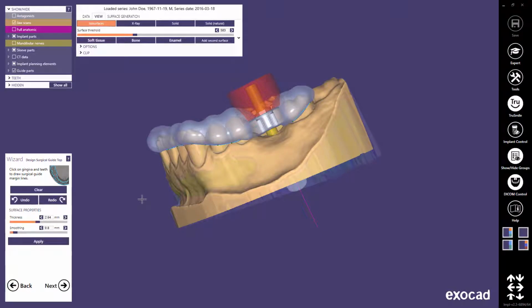When the surgical guide bridges over multiple missing teeth, make sure that the solid fit of the surgical guide is still ensured and that it does not bend under load. In particular, this applies for multiple canine and incisors.